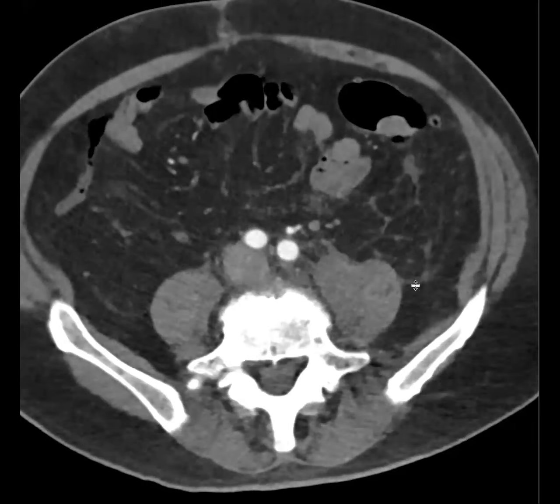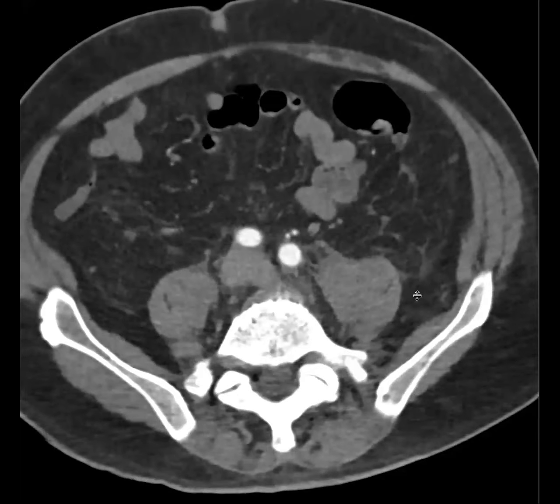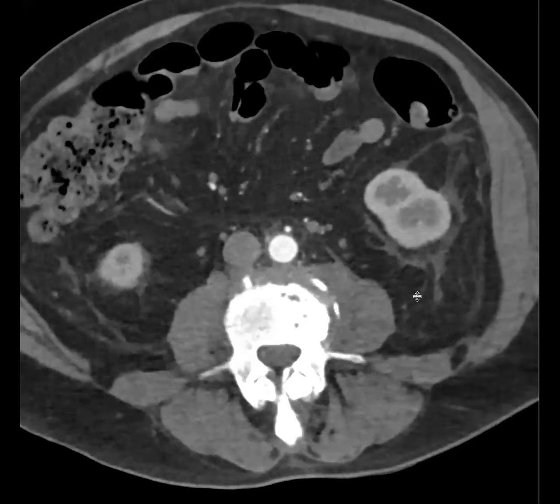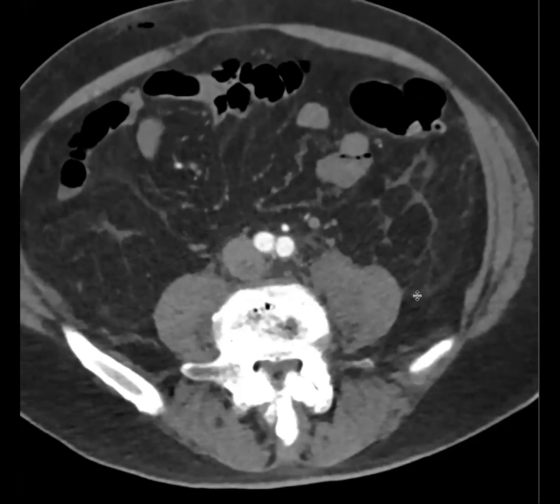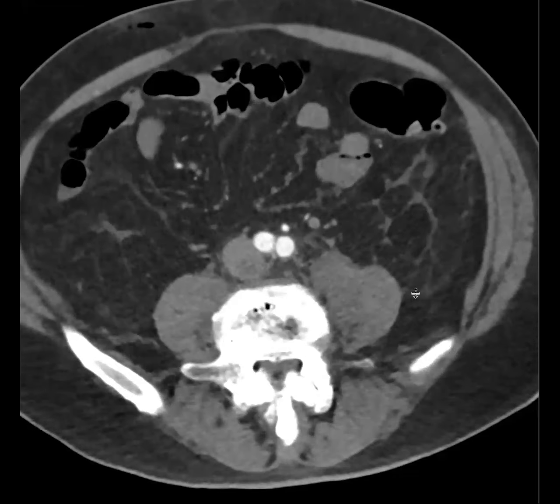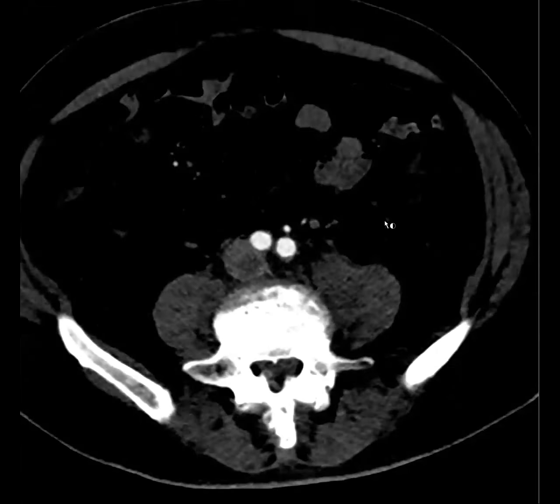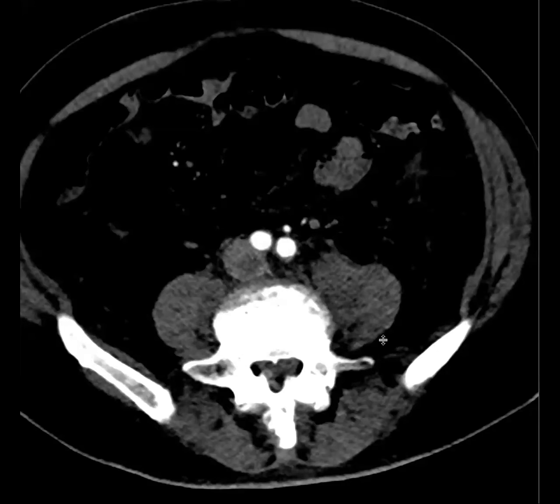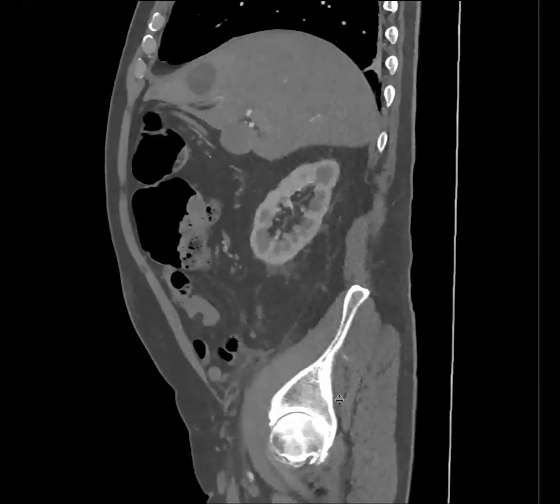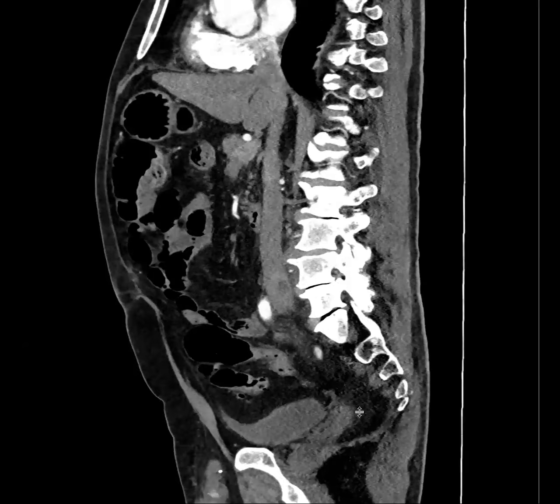I guess this is more of a companion case to the earlier study that you showed with your case of ischemic colitis. Oh, so am I supposed to be looking at the colon? No, no, the veins. Oh, okay. Yeah, I was going to say the IVC looks really distended. I don't see an arterial abnormality, but yeah, the IVC maybe even has a thrombus in it. Yeah, exactly. It's kind of an arterial phase now, but I picked it up on the sagittal.